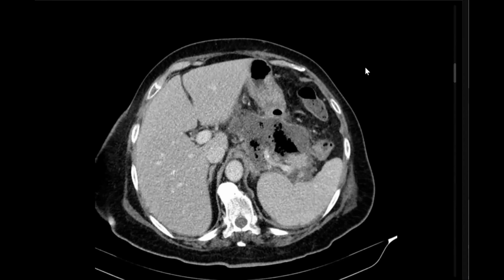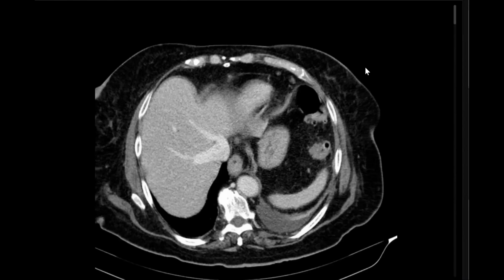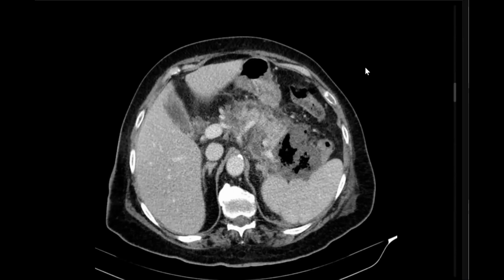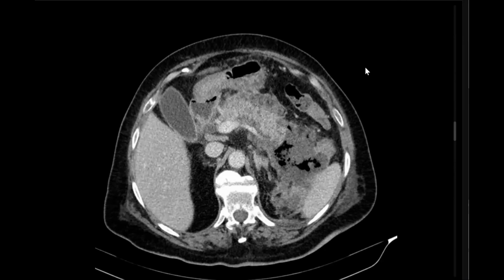I am looking for the other viscera as well. No lesion in the liver parenchyma, no abscess formation. Gallbladder is normal. When to perform a CT if suspected pancreatitis? In the first day of suspicion? When there is any complication, then CT pancreatic protocol is going to be performed. Okay.